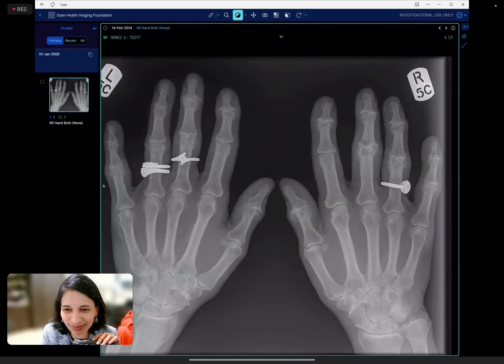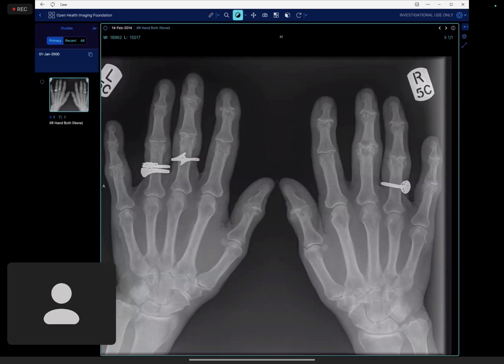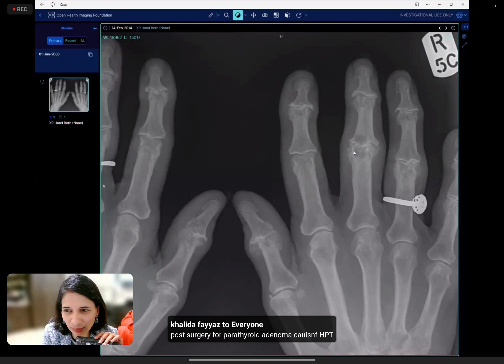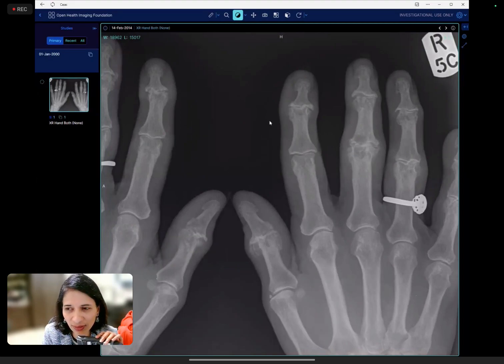And you said erosive osteoarthritis. An elderly female patient, with this distribution, it's usually erosive osteoarthritis. That's the typical presentation, and they will have Heberden's nodules and soft tissue swelling in these knuckles as well. Okay, so that is typical.